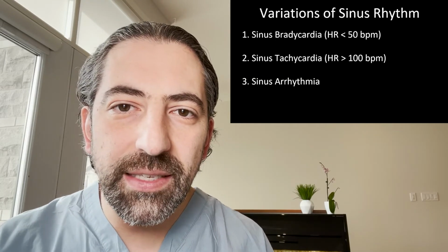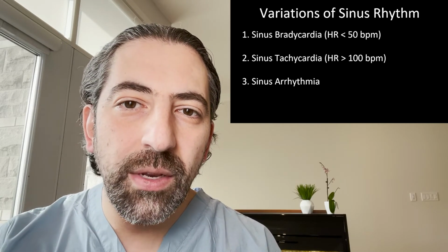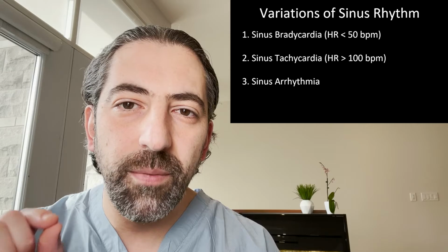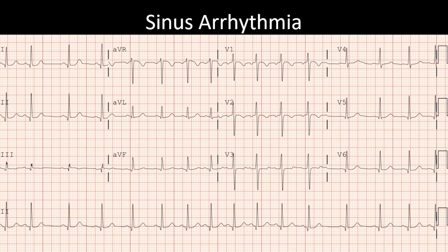Finally, we'll discuss sinus arrhythmia. Sinus arrhythmia is a rhythm where electrical depolarization is still originating from the sinus node. There's still a P wave before every QRS, there's still a QRS after every P wave. However, the heart rate is constantly changing, and it's actually constantly changing with inspiration and expiration.